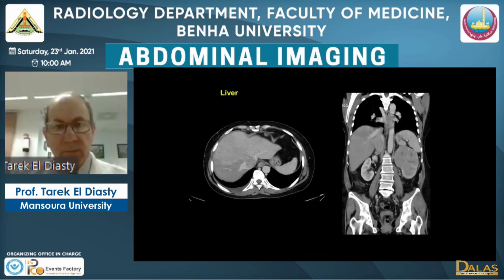Regarding the cause of hepatic enhancement here, the hepatic vein drainage is impeded by this vena caval thrombus. This is a normal enhancement with the draining vein not obstructed, like this one. So this differential enhancement is seen according to the obstruction of the hepatic drainage by the vena caval thrombus.